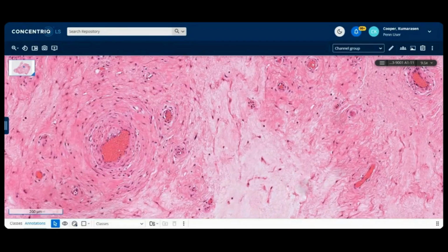Michael, extracellular myxoid chondrosarcoma. I'm moving backwards. Okay, Tom is there. Deep angiomyxoma. I like that, Jan. That's a good aggressive angiomyxoma. Ali. So remember, the WHO does not call it aggressive angiomyxoma. Those are in parentheses nowadays. It's usually deep, open parenthesis, aggressive, close parenthesis, angiomyxoma. Okay, just FYI, because they realize that even though they invade deeply into the pelvis, it's not really that aggressive. So they call them deep angiomyxoma.